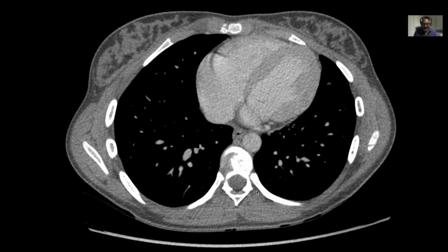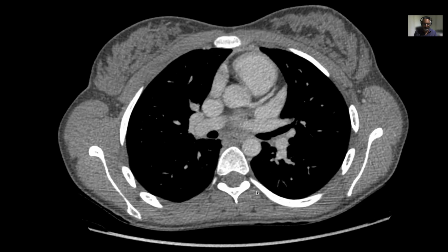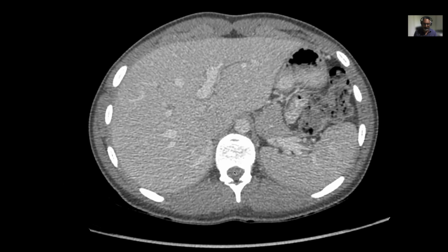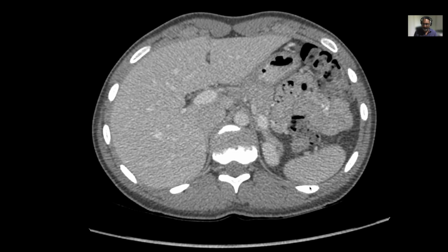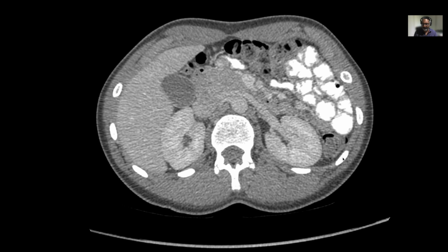And so in the 12th rib that you see down there, you don't really see too much. Let me go back down. So in the 12th rib, you don't see that joint too well. Now that we're at the ribs, we might as well do the ribs. You follow all the ribs all the way.